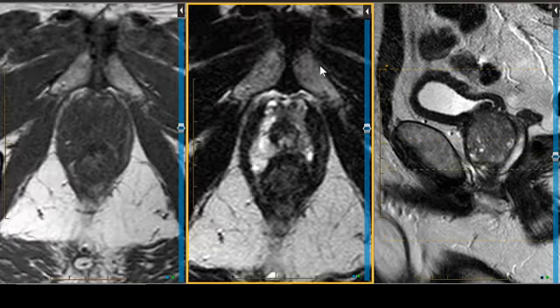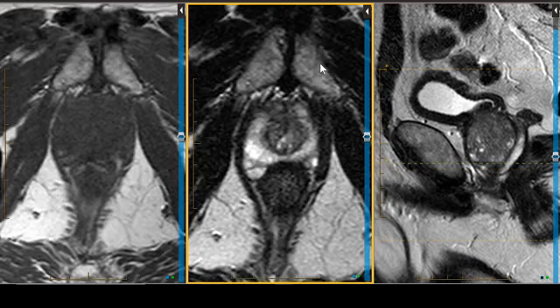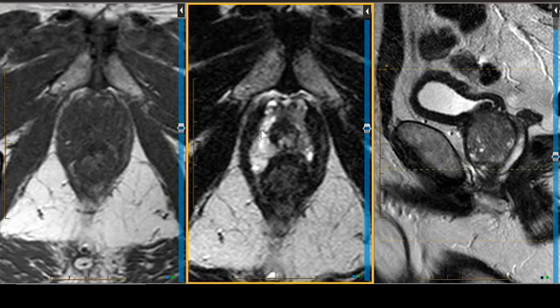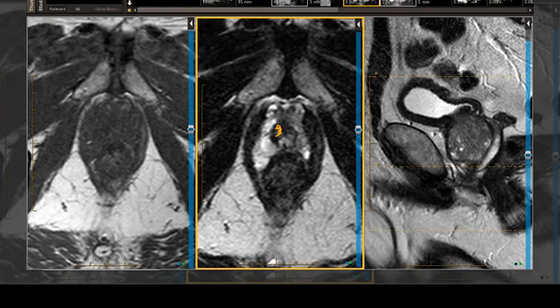Let's go down to the apex of the prostate gland. Things get a little more dicey down here. It's a little tougher to separate things out. Let's stay down at a level where we can still see some peripheral zone. So this patient, there's a little brighter peripheral zone, and we're going to have the same designations, PZA, PZP, and PZM. The darker lentiform AS on the right, I'm going to color it in. I'll make the AS, let's make that orange. The AS on the right is a little fatter than it is on the left. So the AS assumes a more prominent position here, and the transitional zone is much smaller.